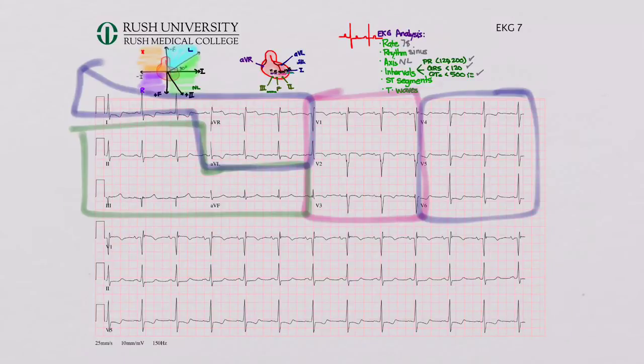And now let's look at our ST segments and our T waves, okay? And let's go here. Oh, it looks like we have some lateral T wave, ST segment depressions here, and over here, also ST segment depressions, all right? These look fairly fine. This maybe looks a little bit high.